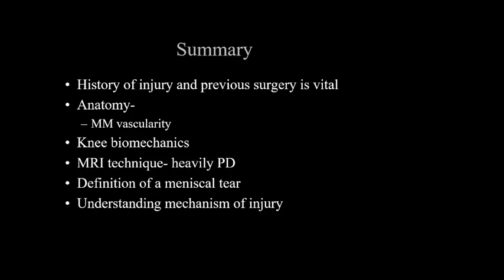Anterior contusion of the femur and tibia may suggest hyperextension mechanism of injury, and so on and so forth. So if you really want to know the mechanism of injury of the knee joint, just look at the bony contusion and the pattern of bony contusion. That should really help you understand the mechanism of injury and what structures may have been torn because of that mechanism of injury.